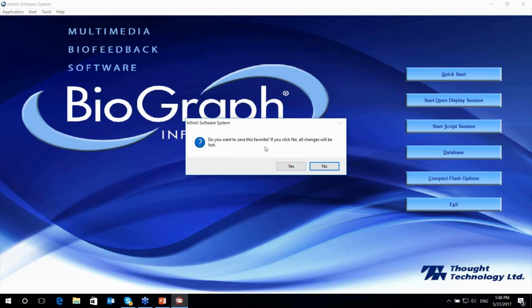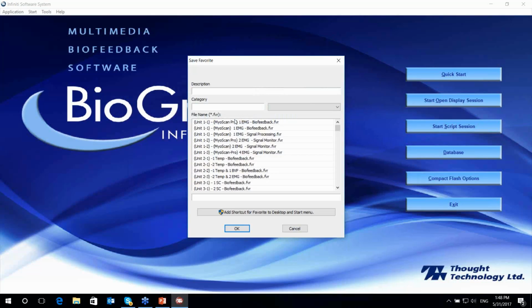Now it's finally going to ask, do I want to save this favorite? I'm going to click yes. And so in this one, I'm going to choose John's breath training. Oops, let's spell this with capital. John's breath training favorite. Under category, I want to choose the same category I had before.